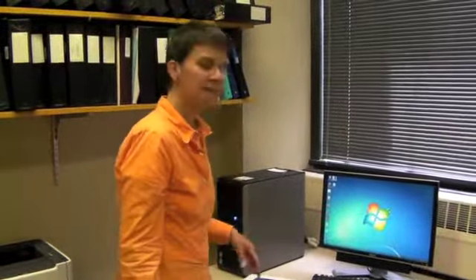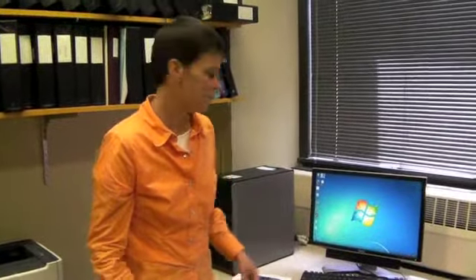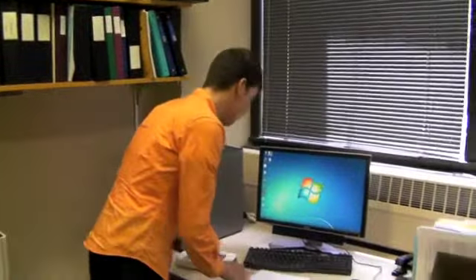And the hope is that every week, at the end of the week, during testing, during the Validum study, you'll take these two steps. They're fairly simple, but I want to walk you through it so that it's clear as to how to go about it.